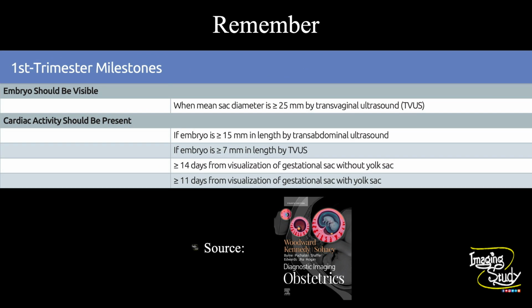Now the take-home message. Whenever you see an embryo in early pregnancy with no cardiac activity, before telling it as missed abortion, you definitely should look at your machine. It may not be the embryo which has no cardiac activity, rather it might be the machine which can't show you the cardiac activity at that age.